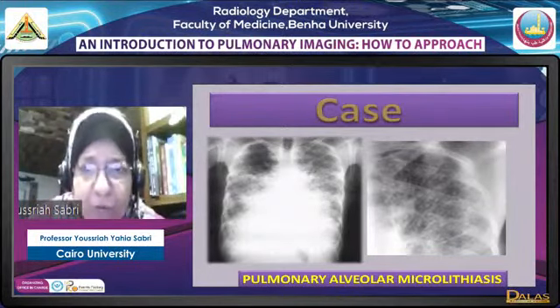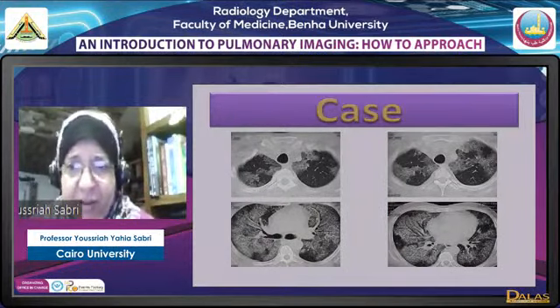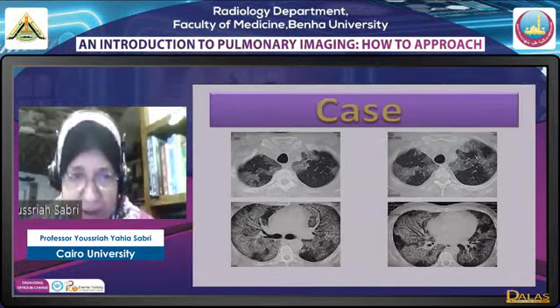Now again, we have a diffuse bilateral disease showing the classic crazy paving.